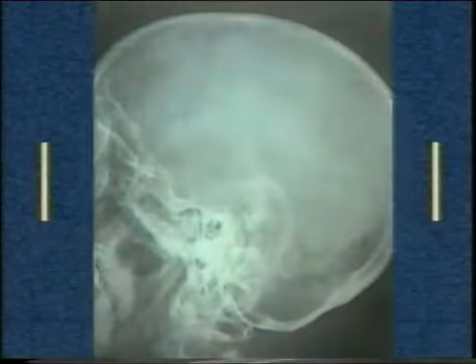Now we will study the X-rays of the skull. Fracture lines on a skull have to be differentiated from the normal suture lines between the skull bones and also from the normal vascular markings. A fracture line is seen as a narrow dark line. The suture lines are wavy and have a fixed anatomical location and direction. Vascular markings are faint, smooth, and if traced towards the vertex, they branch out. In contrast, a fracture line is a straight, dark line anywhere on the skull.